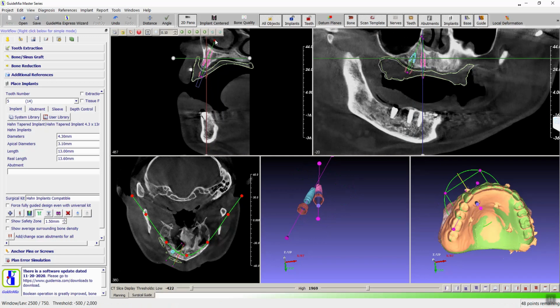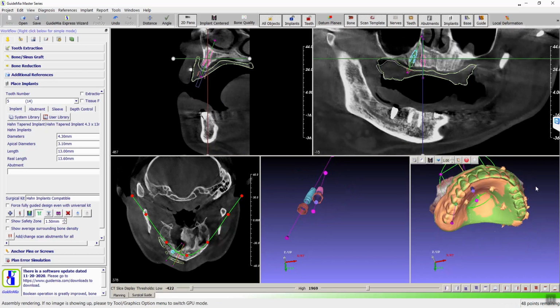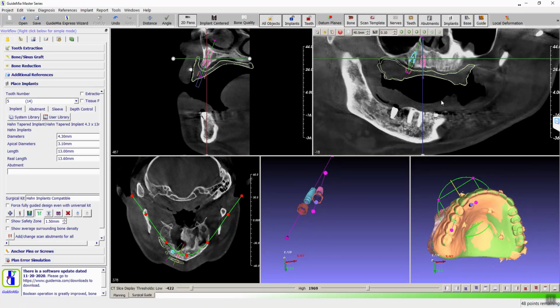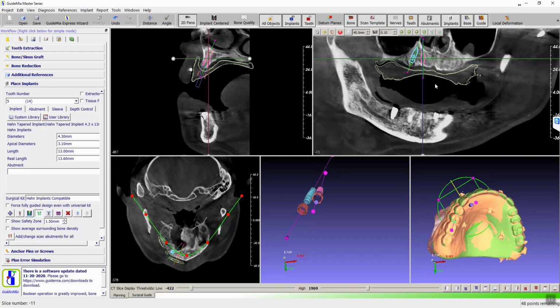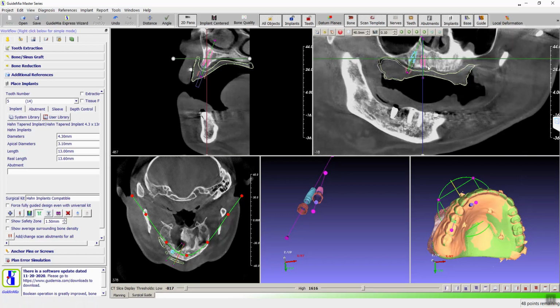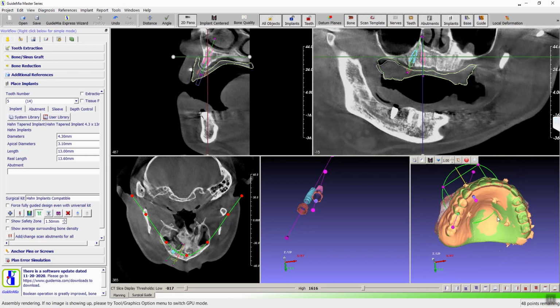You want to just tilt like this, or you want to do something like a parallel? We've got to do the bone reduction, so we need to go deeper. Correct. Because I think the bone reduction is going to be on the anterior segment.